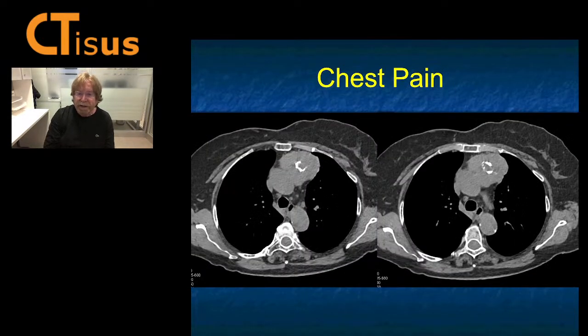What about this one? Anterior mediastinal mass, middle-aged patient, whatever middle age is, solid with calcification. What could I think about? Teratoma, I would like to see fat, but that's a thought. Lymphoma, I like lymphoma without calcification, unless it's been treated. I don't see anything else, but I guess lymphoma could be. Could it be thyroid extending down? I guess it could be, because you don't know how far up or how far down this lesion goes.